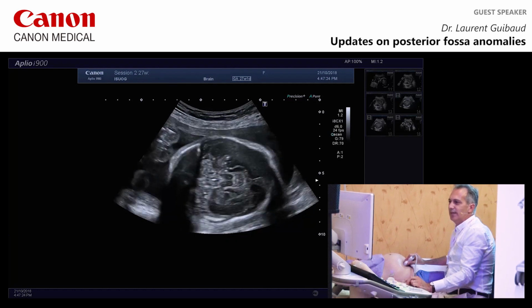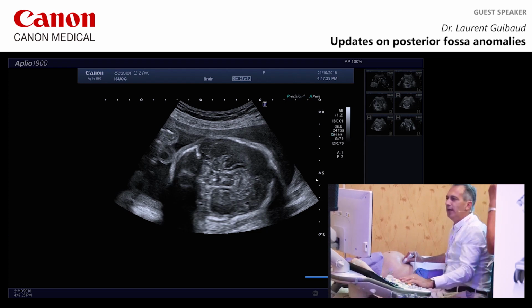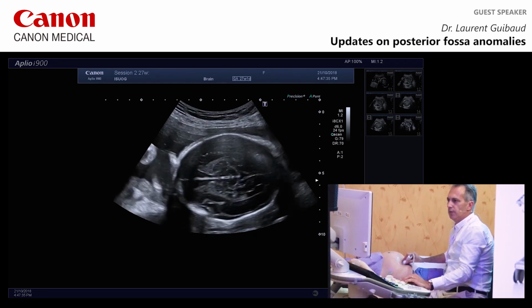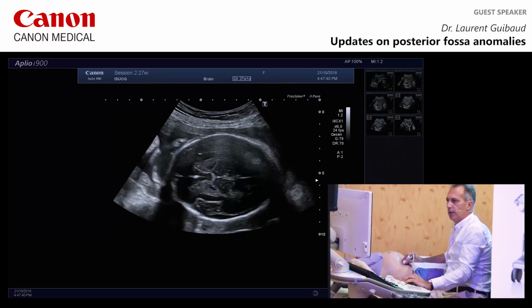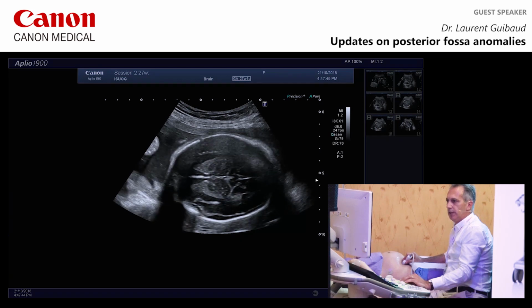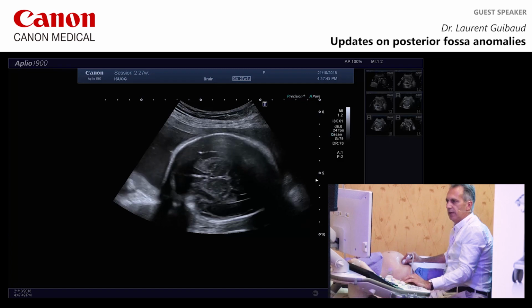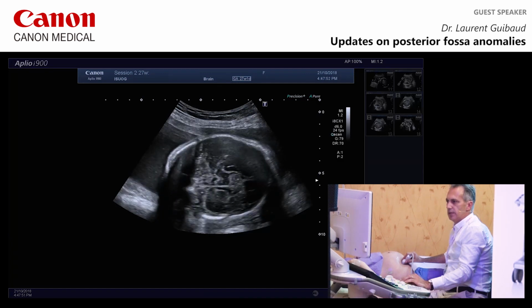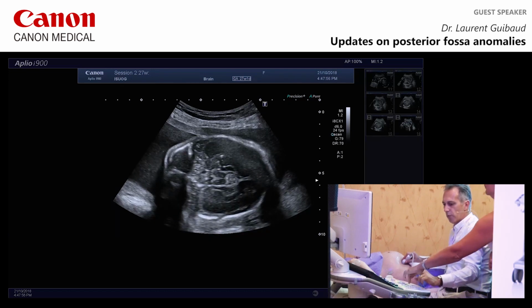Depending, yes. Here, you see, I will try to show you. In fact, we have here the optic nerve. So what you do, you go to the cavum septum pellucidum. You go to here, you are on the trigone, here the pillars of the trigone, and just below, you have here the polygon of Willis.